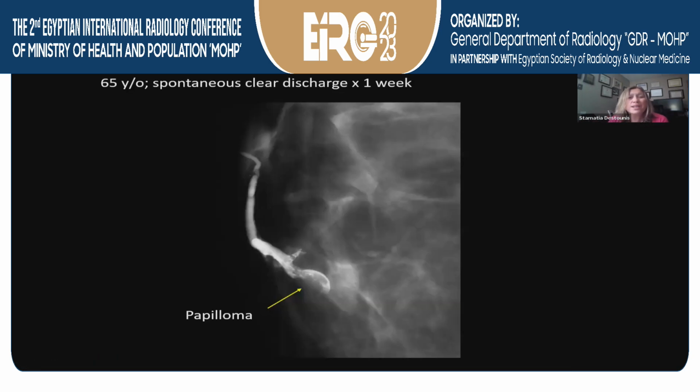As opposed to this ductogram in a 65-year-old that had spontaneous clear discharge for a week. And you see this is a dilated duct. And then here we have filling defects in this dilated duct. So we biopsied this area under ultrasound.